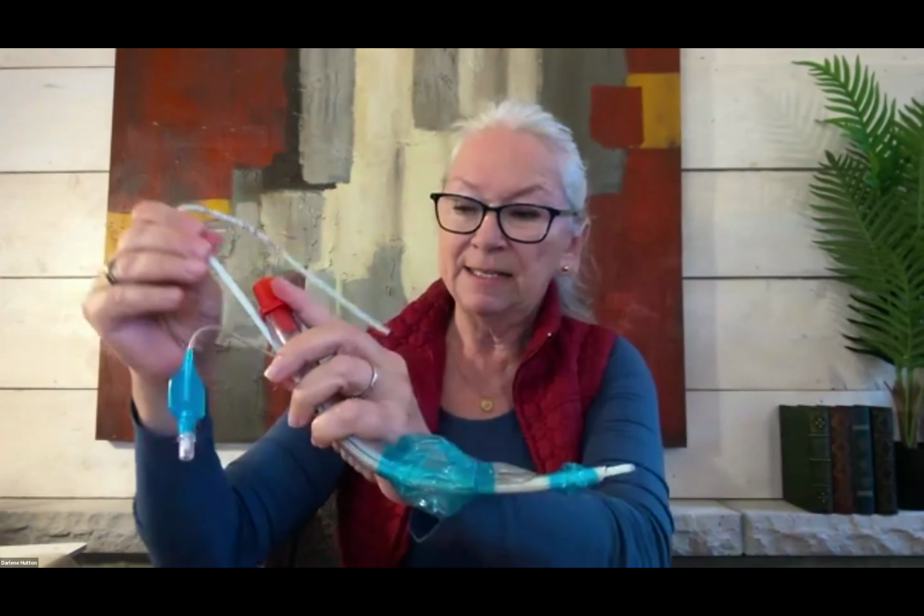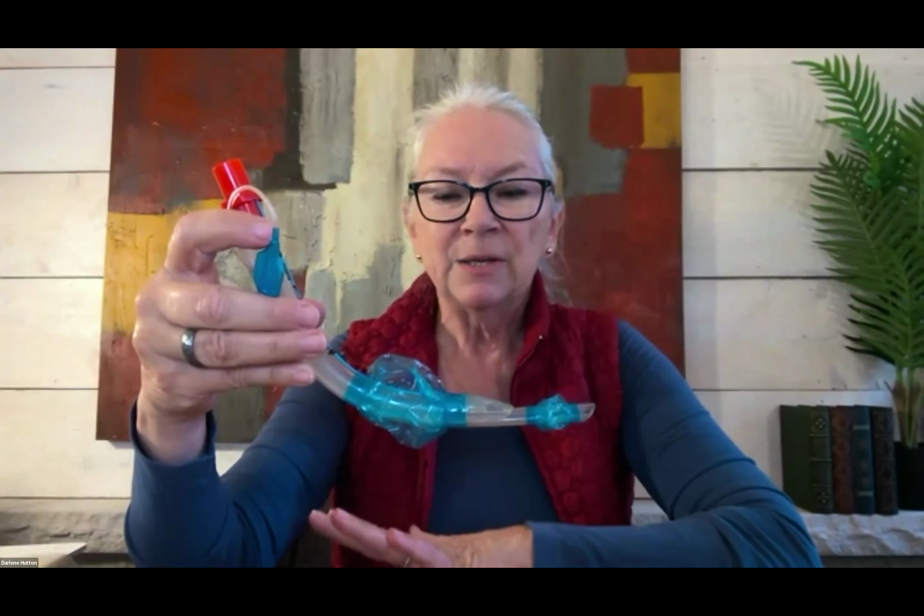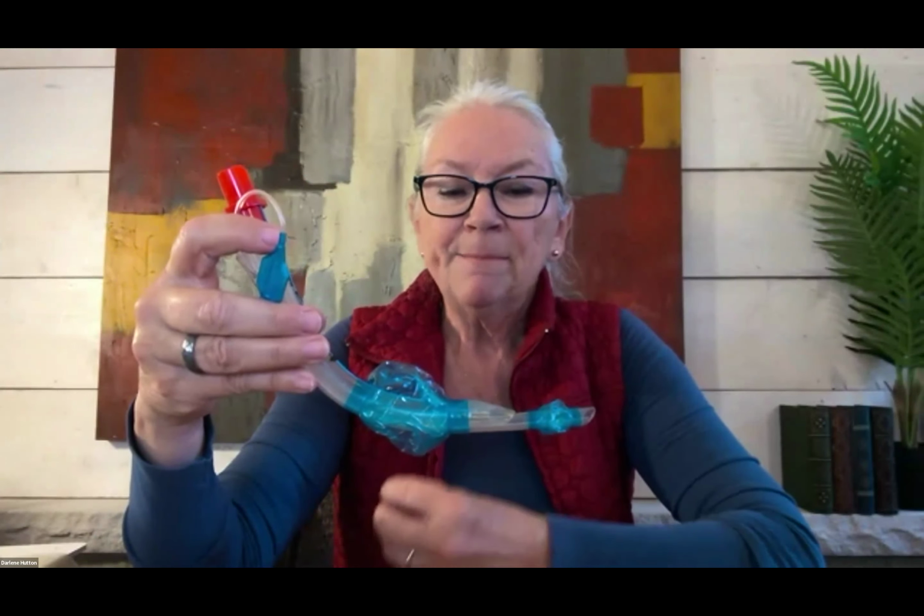The downside of this is that the pressure on the soft tissues can be so great that it can cause ischemia to the surrounding tissues. So the recommendations are, it's not a long-term airway management device. If your patient is in a cardiac arrest in this type of presentation with the LT and they survive, what will happen as soon as we're in the post-cardiac arrest part of their algorithm is we would look at switching this out for an endotracheal tube. So that's the introduction to the 3 options for advanced airways.